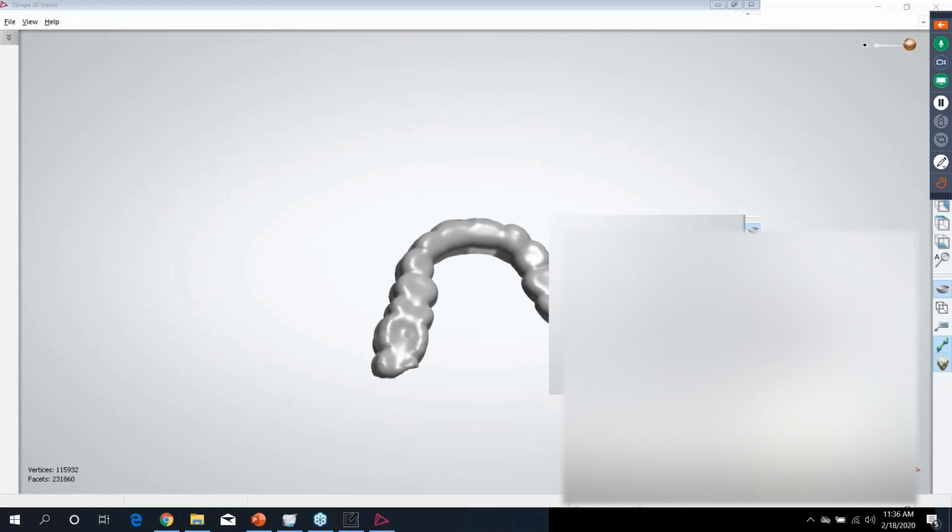This is something that I recommend playing around with a little bit. One of those things that oftentimes comes down to preference, the patient's preference, doctor's preference, etc. If you want to start with 0.1, print a couple splints, test the fit, see what the patient thinks. That's a good place to start. If they feel that it's too loose of a fit, then you can reduce that to 0, and it's going to make that fit tighter.